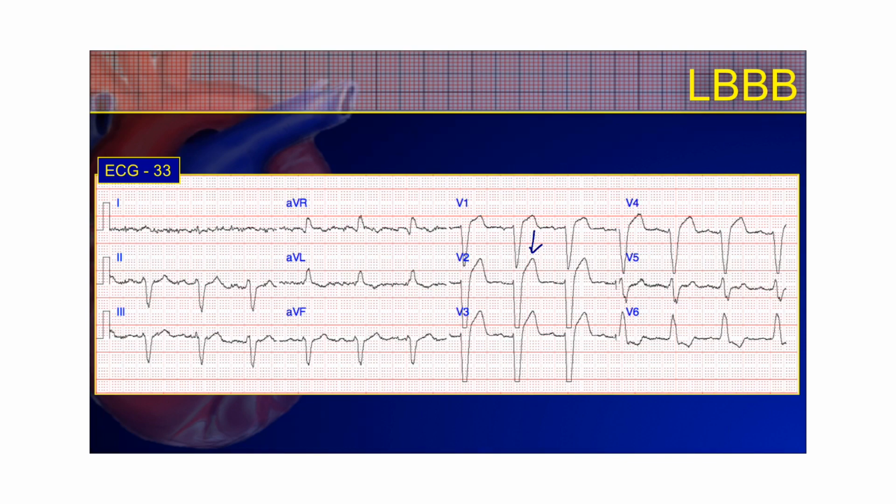If you look at lead 1 and V6, V6 has that monomorphic upright QRS complex. Lead 1 has probably something we call the lead 1 sign, which is indicative of chronic cor pulmonale or somebody that has COPD. So you can't really trust anything you see in lead 1 because of the very low voltage.